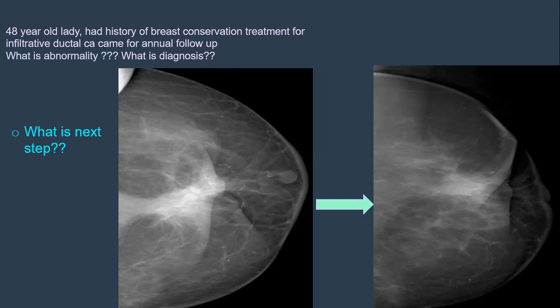You cannot say advanced because of positioning. Here the nipple is in profile and there is retraction, but the nipple here is within the breast. It's difficult to tell, but there is some irregularity and wrinkling of the areolar skin due to retraction, postoperative. But you can consider the dense area of asymmetry. This area of asymmetry is definitely getting less in size and in density.